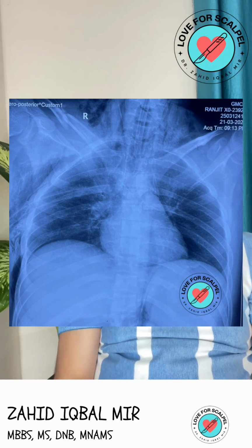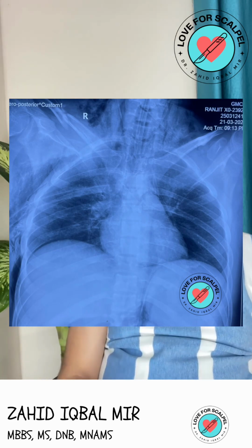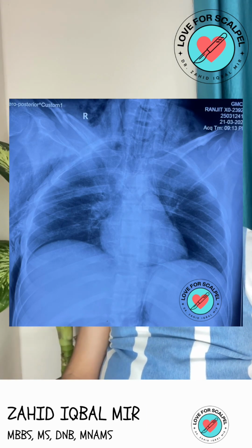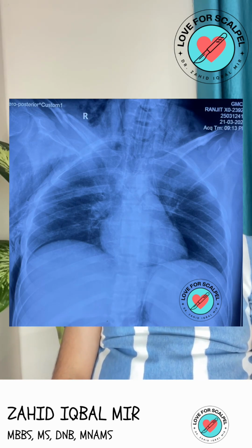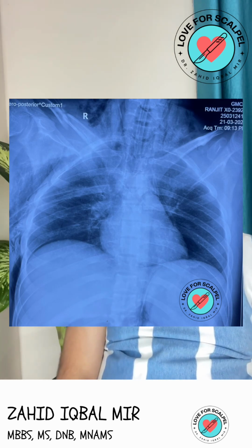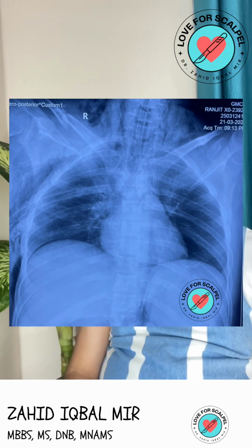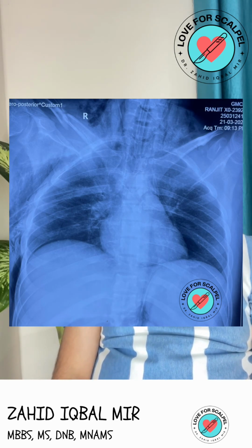So in addition to this, what we can appreciate here, we can see surgical emphysema in the right chest wall and in bilateral neck. Then there is a chest tube in the right thoracic cavity also, and we can see there is endotracheal tube also in the trachea. So that means the patient is intubated. Besides, there is a fracture of the right clavicle and fracture of bilateral scapula, which is also visible in this X-ray. Okay, so finally this is a post procedure X-ray of tension pneumothorax.